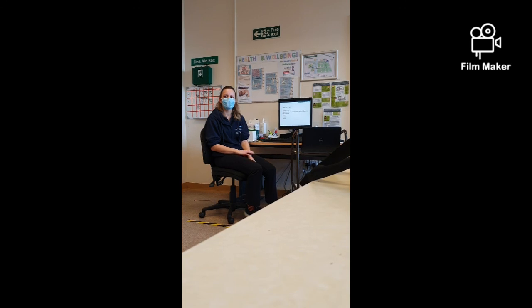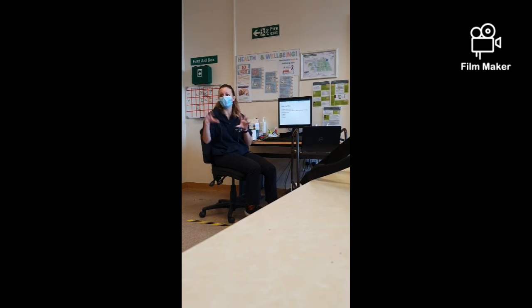Little one. I think I know, but I don't know for sure. If there's any tumours or anything, how will that show on a chest X-ray? Will it just be an area? It'll be like a white dot. But if we're thinking from a lung point of view, a lot of the time it's metastatic, it's mets, so there'll be lots of little white dots all over the lung. But they'll be more obvious, if that makes sense. Oh yeah, they'll be very obvious.